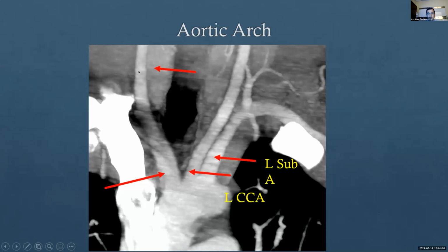So these are the common carotid arteries. Those are the two major arteries that are going to supply the anterior, the front part of the brain, where things like movement and sensory are. And the subclavian arteries are going to supply the vertebral arteries, which go through the spine to the back part of the brain. That is going to involve things like the brainstem and things involved in vision. So all critically important vessels.